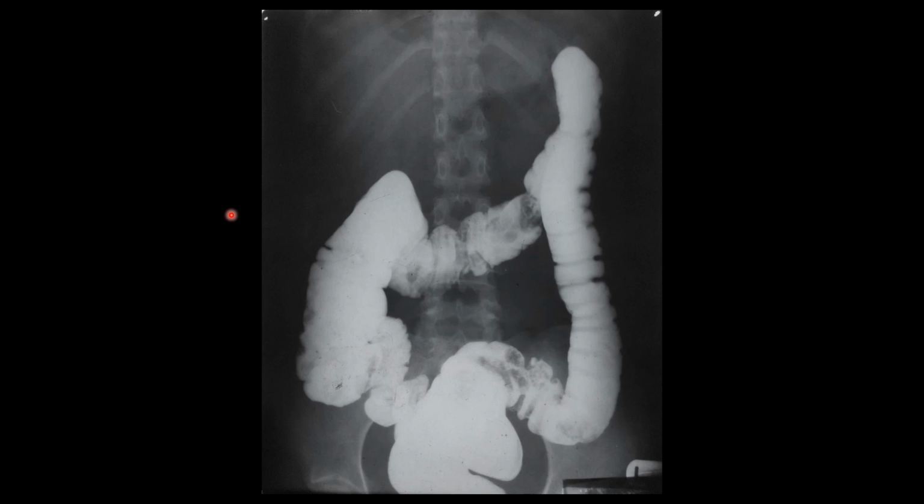After that, we can prepare the patient. After that, this colon will be easily outlined by slowly running in 2 to 3 pints of simple barium sulfate suspension through the anal canal. Then we take consecutive X-rays. Then we will identify the different parts of the large intestine.